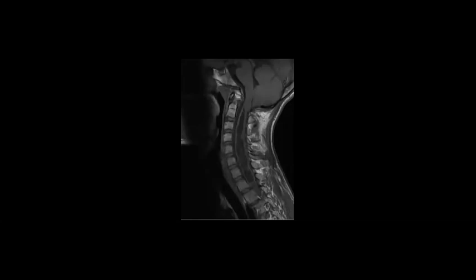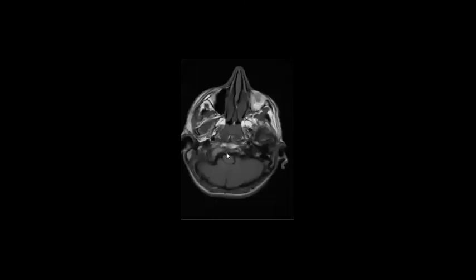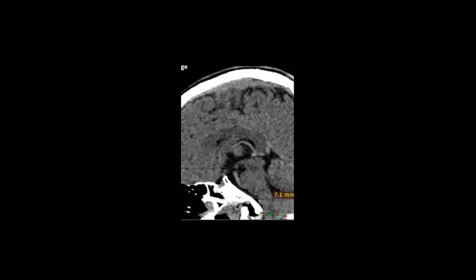Why Chiari 1? Just describe shortly. Yes, syringomyelia. And what else? There is tonsillar herniation. Yes, perfect. So there is tonsillar herniation with syringomyelia. You can check in the axial images for tonsillar herniation with syrinx.